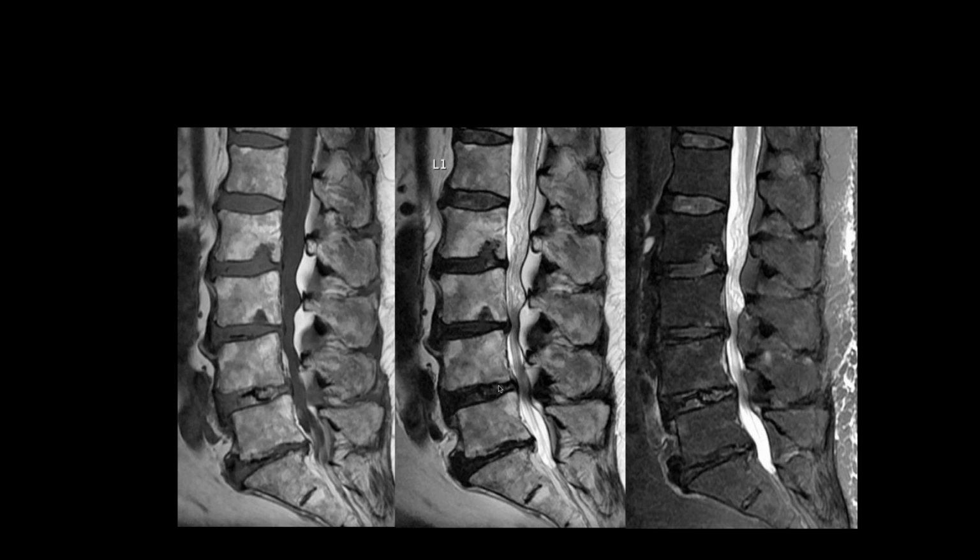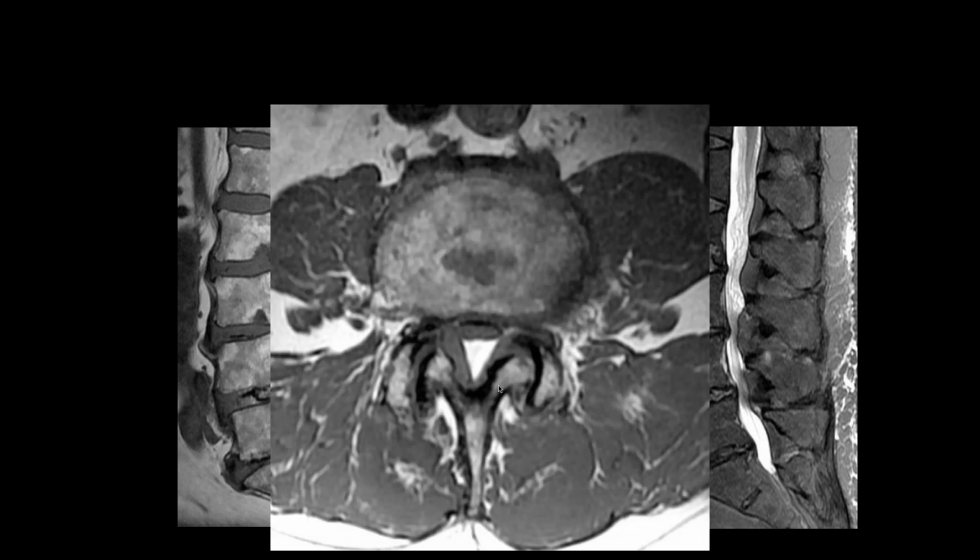Okay, there's a lot of... lipomas don't hurt. There's a lot of end plate disease, and I think prominent epidural fat, at least posteriorly, as far as the cord. It's epidural lipomatosis, and this is one where a lot of people have a lot of arguments.